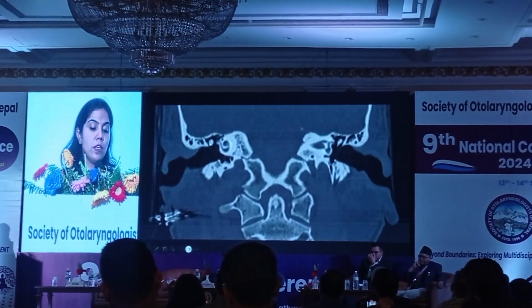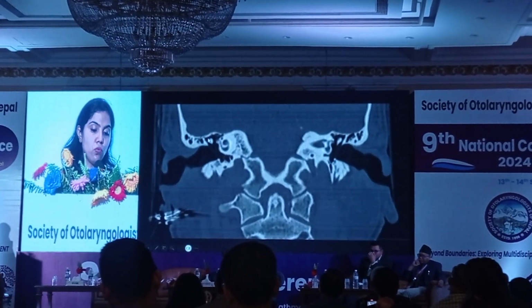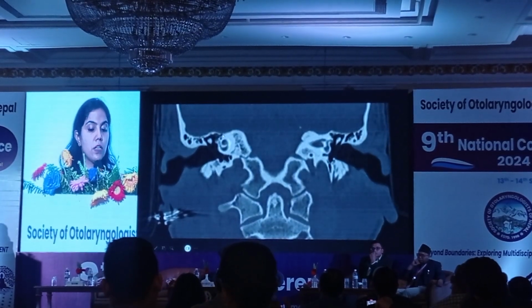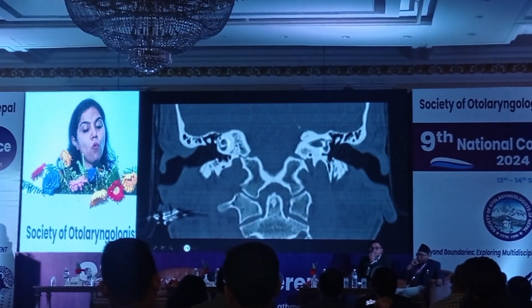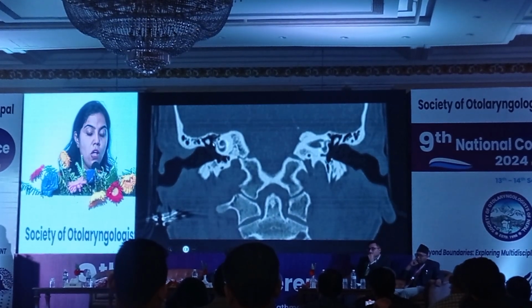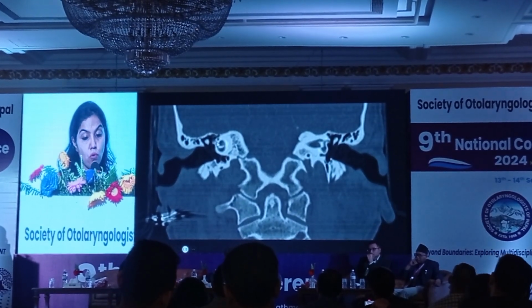This is my incudostapedial joint which I am able to appreciate, and these are the two dots which are just before the cochlea. These are the two dots of facial nerve. If bone is not present here, then facial nerve can be lesioned in the tympanic segment. So it is very important to see these two dots of the facial nerve.